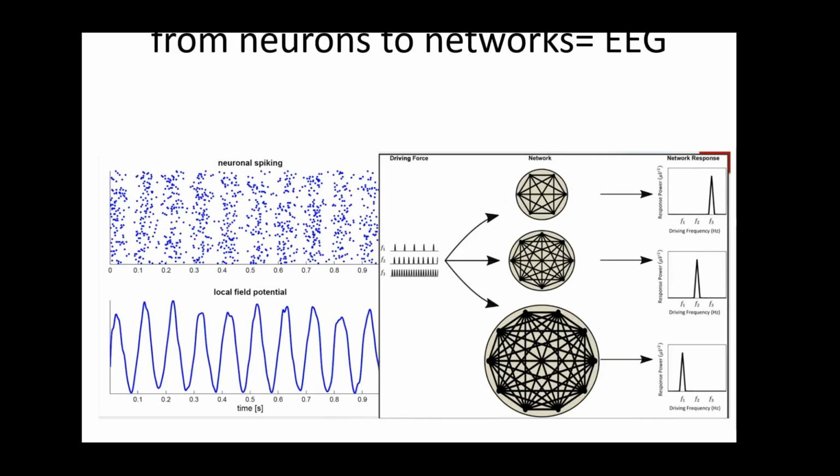All right, so the first thing is, when you look at the EEG, whoever is not a neurophysiologist looks at the squiggly lines and wonders what they represent. The EEG is a great tool to see what the brain is doing at a given time.